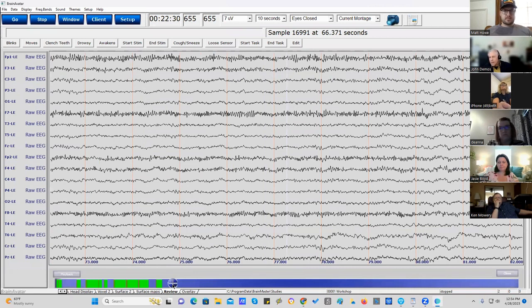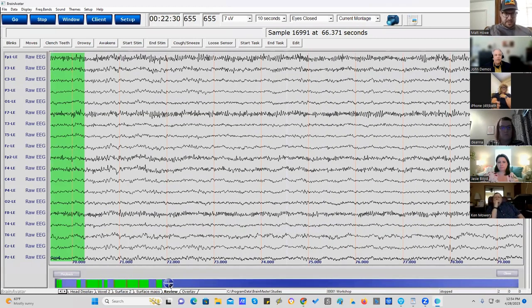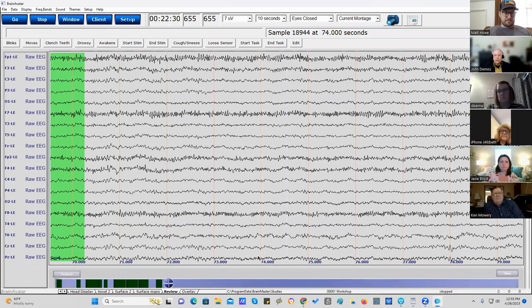Now, Matt, you had some questions or a question, please. Yes, the numbers, like on the current screen, you see 71, 72, 73. I was just trying to determine if that was seconds or how that was. What are the numbers? Excellent question. You see where it says 74 down here? I'm at 74, and that's why it says 74. What we want is an actual value of how many seconds we have acquired.